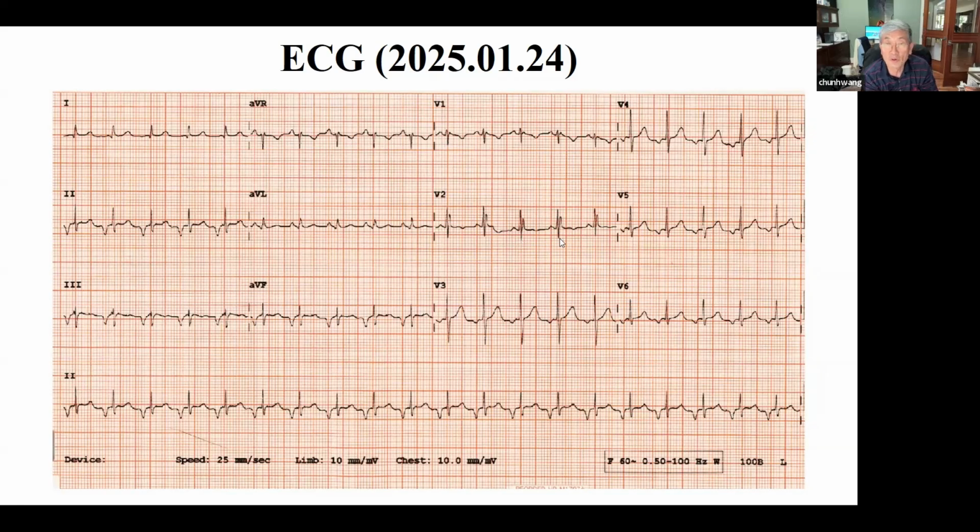So I think it is more of a right bundle pattern because if you look at the R wave progression, V6, even though it's R, is smaller than V5 and V4, right? Amplitude-wise. So is this QRS activation sequence normal or abnormal?